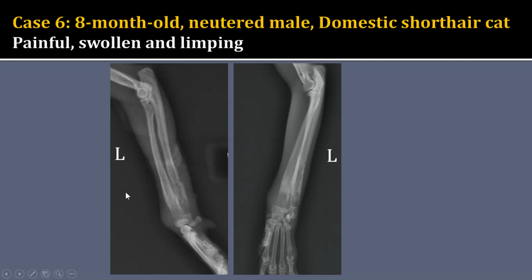So in this age patient, at 8 months old, with this degree of osseous change, we have to consider probably some sort of infection involving more than one bone. This could be a very severe bacterial infection, especially if the patient was compromised in some way. But this is such an aggressive lesion, we should consider fungal osteomyelitis as well. And in this patient, this was actually a histoplasmosis fungal osteomyelitis. And we would have to determine that by sampling and then maybe culturing and doing a sensitivity as well in case it was fungal or a bacterial infection.